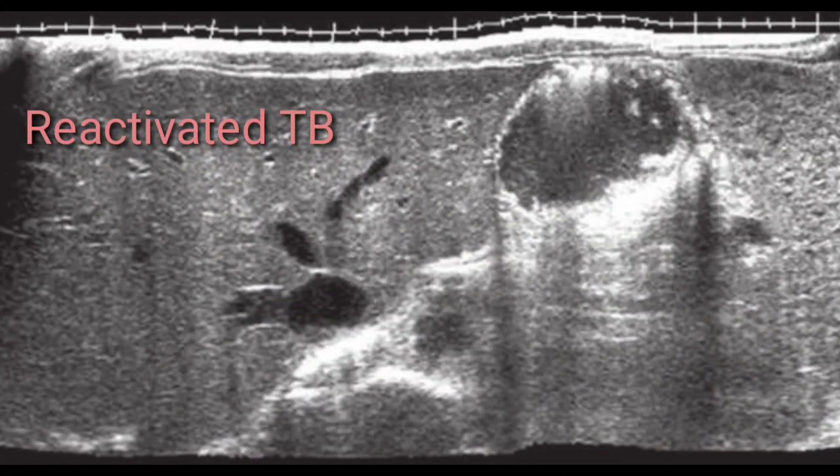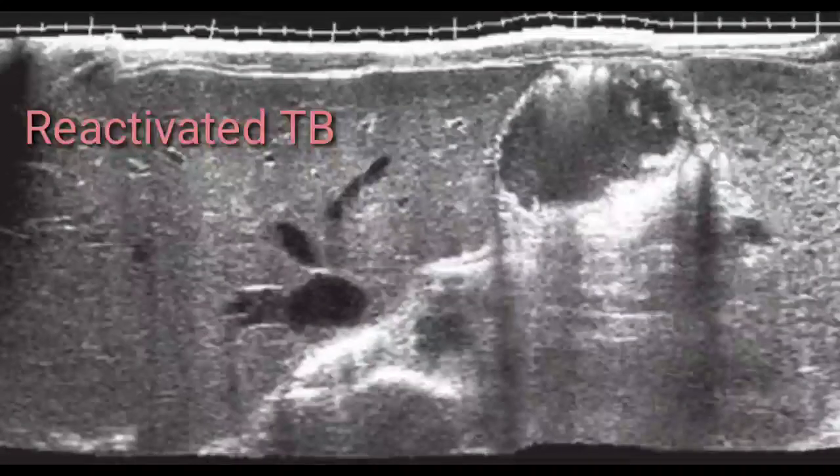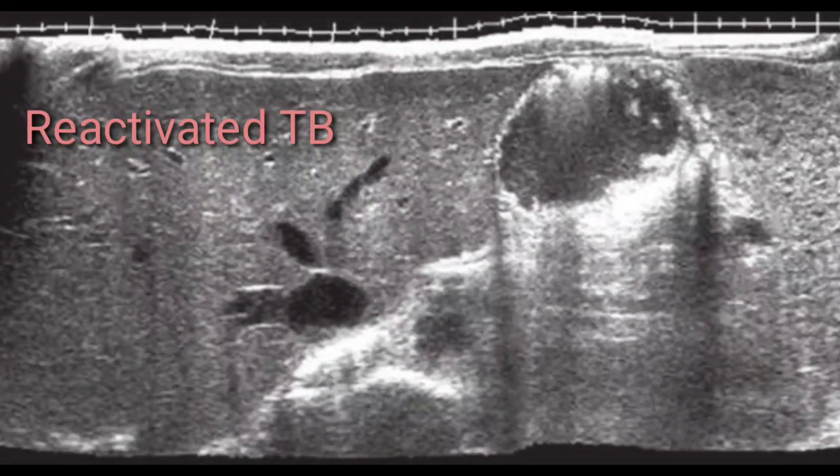Mention the size and site of the lesion. Give its dimensions. Three-dimensional measurement should be in your report. Give its characteristics. Keeping the patient's previous history and record in view, this suggests tuberculosis. This lesion is suggestive of a reactivation of tuberculosis, and further workup for confirmation of post-primary tuberculosis should also be mentioned in your report.